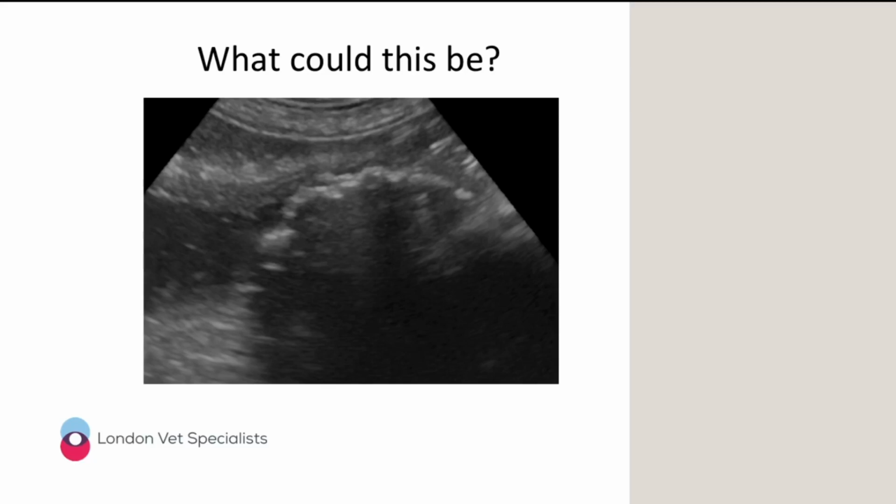So our last foreign body for now, this one was found in a 5-year-old male-neutered puggle. This structure here is the foreign body. It's 2 centimeters long and it's 1 centimeter thick. And hopefully you guys can appreciate that the orad bowel is quite dilated here. Again, it has a curvilinear surface, and it's very rough, so it's all bobbly, and we've got this strong acoustic shadowing associated with it. So any idea what this might be?